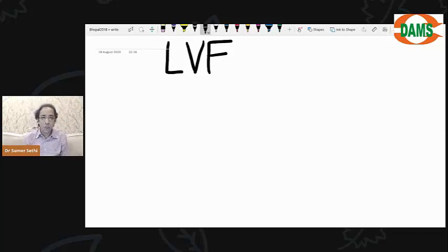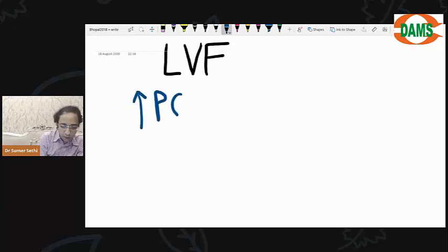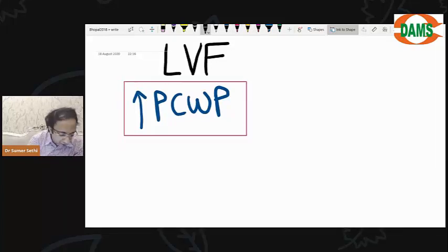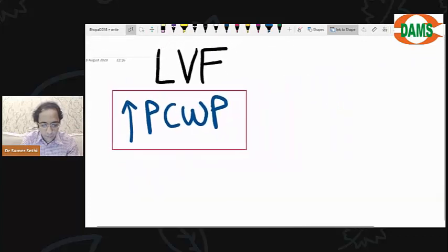So, the first topic of the day is left ventricular failure. Beta, see with me. Now, how do you identify left ventricular failure on X-ray? If you have left ventricular failure, it leads to an increase in pulmonary capillary wedge pressure, PCWP.